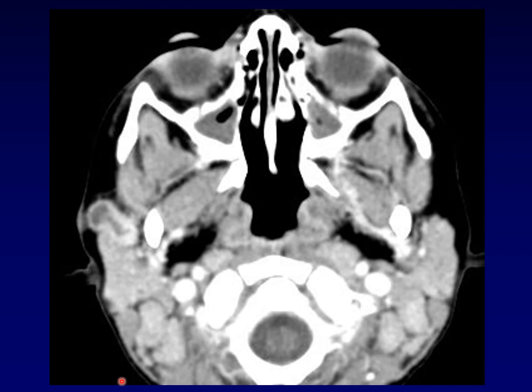This is atypical mycobacterial infection of a lymph node, a pre-auricular lymph node. And this cystic degeneration is characteristic of that disease. So is skin thickening, and so perhaps there is a clue here that we're dealing with mycobacterial infection rather than an infected branchial cleft anomaly.